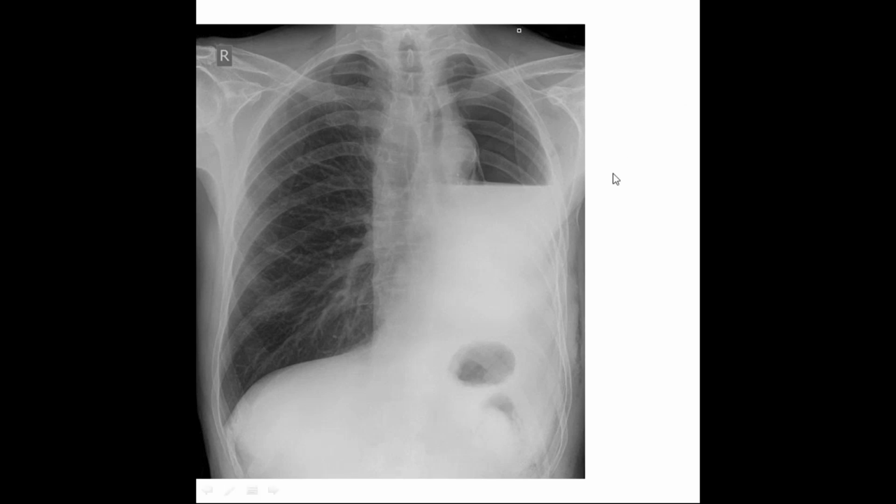Okay, so now we come on to this. What is the abnormality on the right side? Right side, as we discussed, was the patchy consolidation in the previous X-ray that I'm talking about. Now, yes, the airway being shifted towards the left is right. Homogeneous opacity in the left lower and middle zones, probably air fluid level present, can be pyothorax. First we say there is a deviation of the trachea towards the left side. Now if you come to the lung fields, compare the upper zone, this and this: the bronchovascular markings are there on this side, not on this side. What could be a possibility?